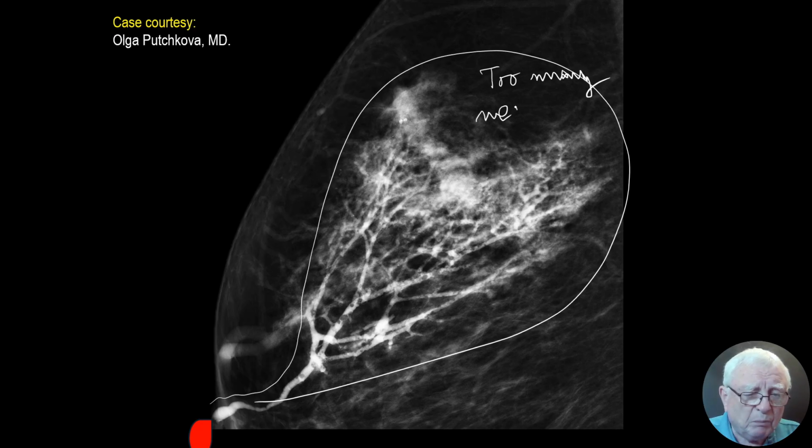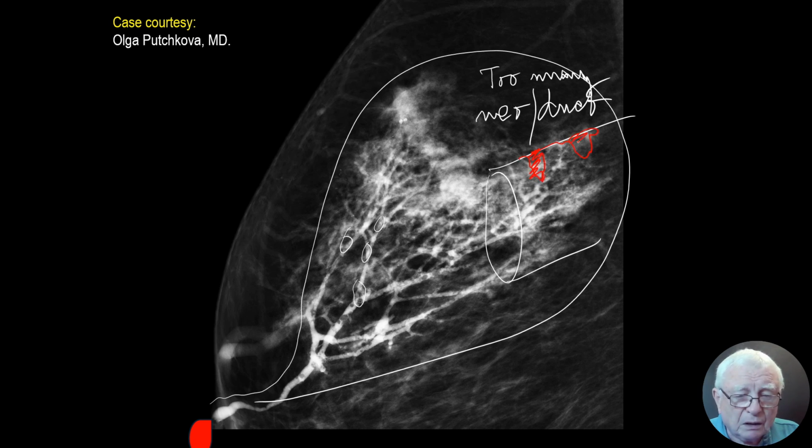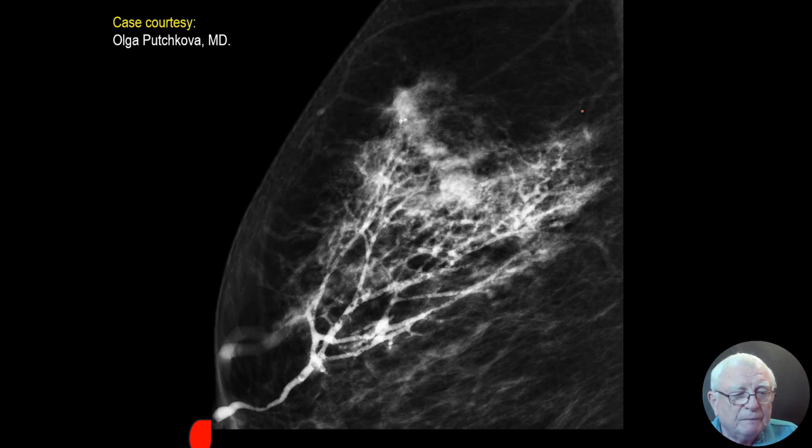They are formed by the cancer. Neoducts. And as you see the large number of filling defects, when the pathologist looks at it, those are going to be the micropapillary growth. So these are duct-forming invasive carcinoma, erroneously called DCIS.